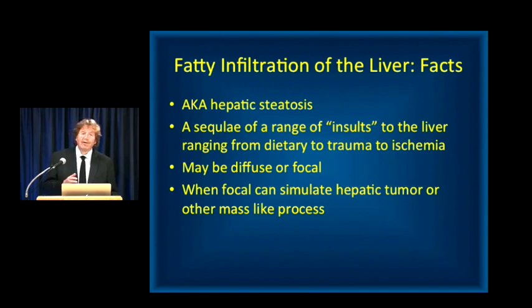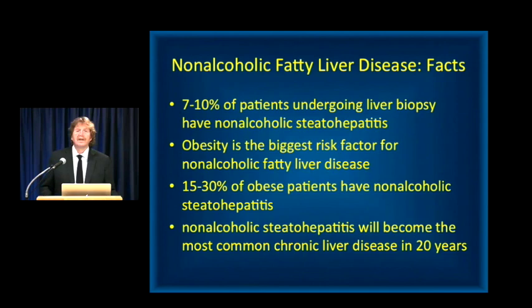It can be focal or it can be diffuse. When it's diffuse, it's very easy to recognize. In most cases, even when it's focal, it's easy to recognize. But occasionally, focal fatty infiltration can simulate hepatic tumor or some other mass-like process. When you look at some of the numbers, 7 to 10% of patients undergoing liver biopsy have non-alcoholic steatohepatitis.